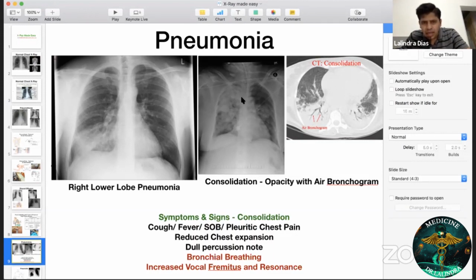Look at this patient. And this patient again, the right lung. It's a very bad patient, isn't it? You can see entire right lung, right upper zone, right mid zone, right lower zone. All three zones. The entire right side of the lung is affected in that patient. So patient has got right side upper, mid, and lower zone community-acquired pneumonia. Can you see this white color? It's not uniform. In this white color, there are black areas, black lines, and black holes. So that's called air bronchogram.